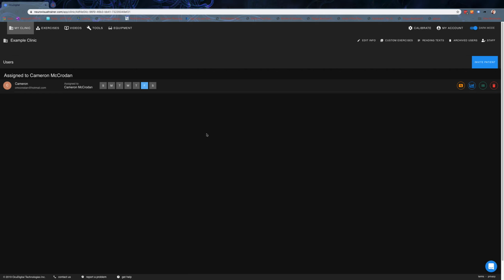So hopefully you found this intro helpful. This program's been fantastic in our clinic for quite a while now. And hopefully as everybody gets using it, people will find the same thing.